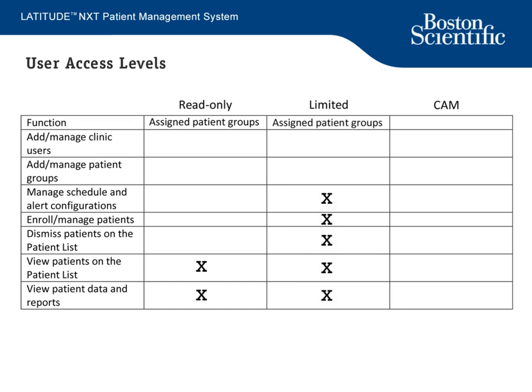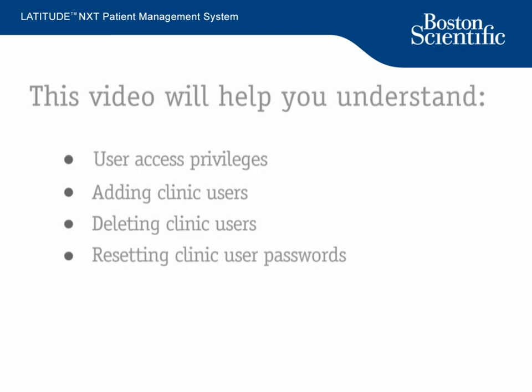Limited access is designed for users who are responsible for managing patients. These users have full access to manage patients in his or her assigned patient groups. Complete access, also known as Clinic Account Managers, or CAMs, is intended for users responsible for managing the clinic users and patients. CAMs have access to all patients within the clinic. A CAM can add and delete clinic users whenever the clinic requires it.